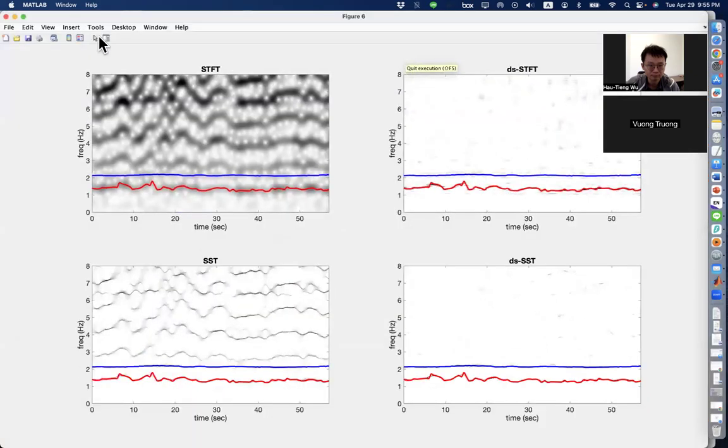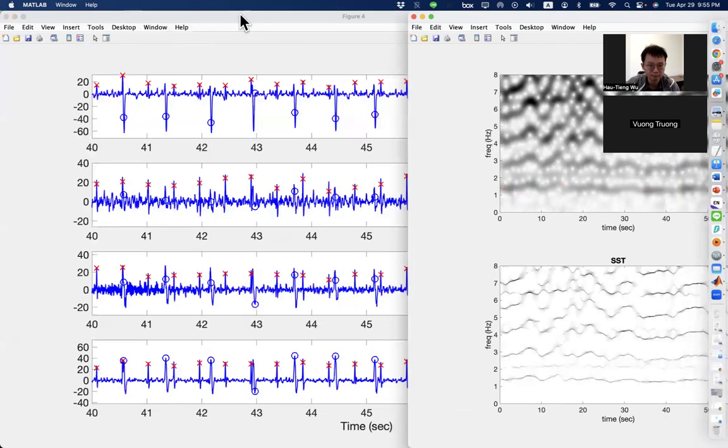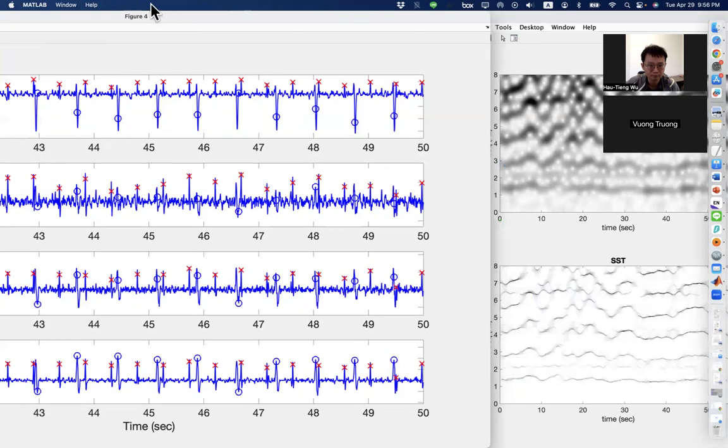Okay, very good. So now this looks better, much like what we expected. So now I detect maternal R peaks using this channel. Then you see there will start to be some kind of erroneous detection, although it is not super strong. You can still see the heart rate is not too bad, but it is already slightly wrong, so that you need to do some modification.